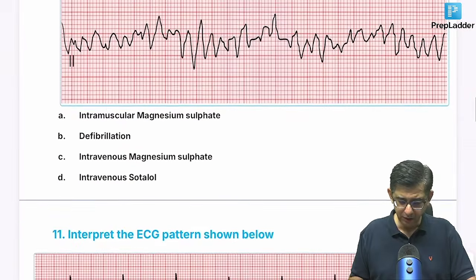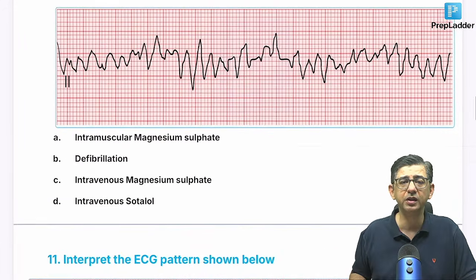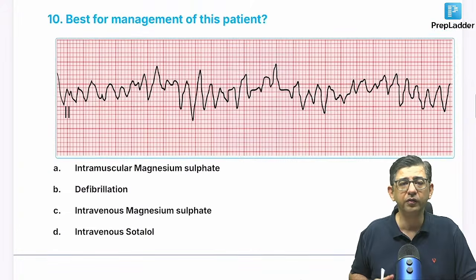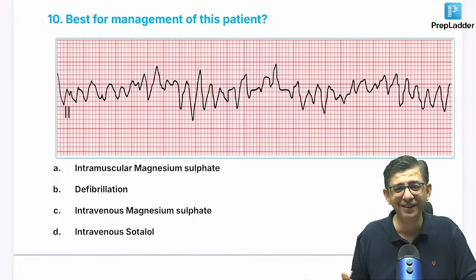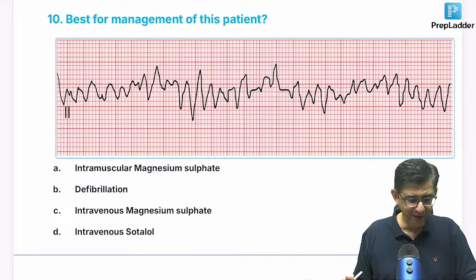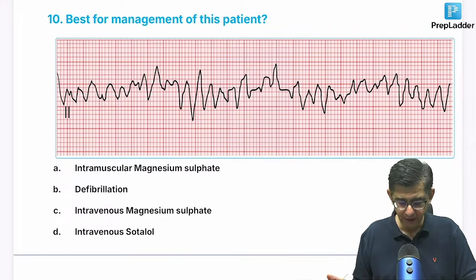Okay, G. The next one is super easy. Let me know the interpretations here. Yes. Would it be, कुछ बोलूँगा तो एक्चुअली आंसर ही क्लियर हो जाएगा. सो आई विल वेट फॉर योर क्विक कमेंट्स फॉर दिस वन. Twitching around the baseline happening in this case.